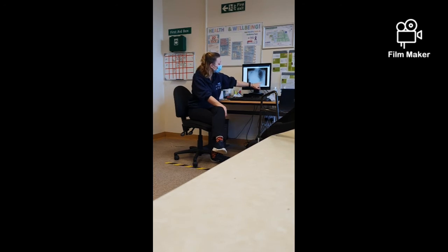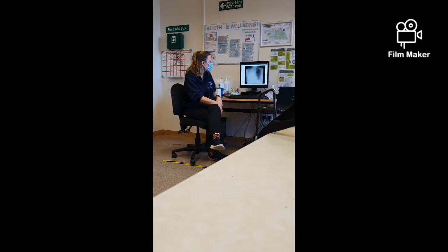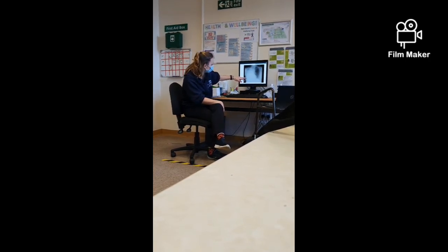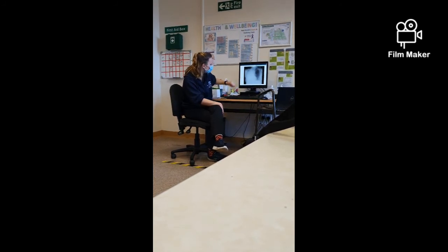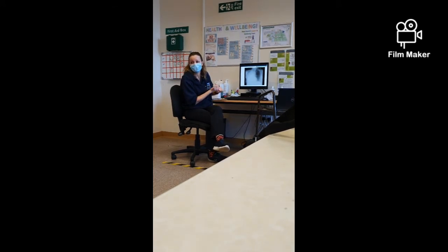We can see that angle. Yeah. And we can see a bit of the angle there. But what can we see on the right? You can see a tiny little bit of the angle, it's not very clear. Is that in the corner? We can't really see anything here, can we? It's just all white. Okay. So we can't clearly see the diaphragms and we can't clearly see all the angles. So anything else?